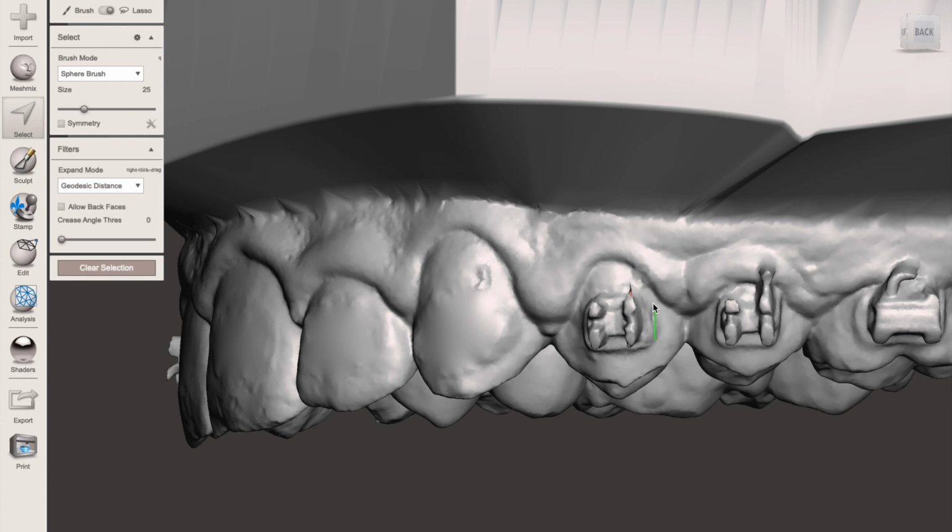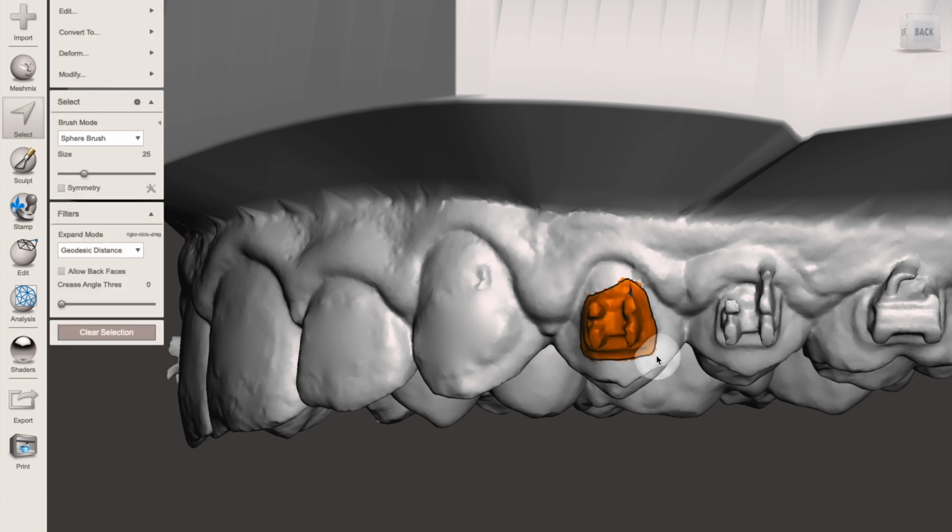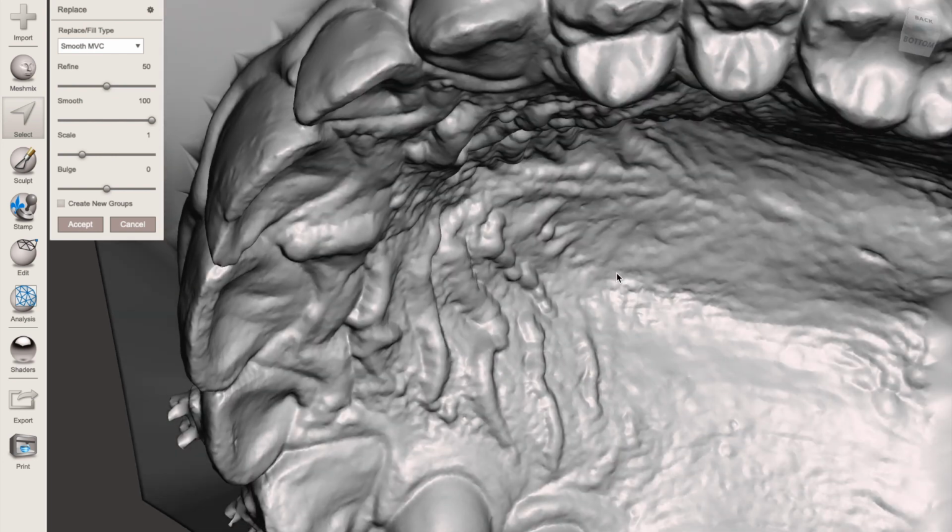So in this instance, you see there's a small crack just above the bracket due to a scanning error or something like that. When you finish your lasso, it'll show up black and nothing is selected. It's because of this little area here, that little crack. So when you select that and say you've got a little aberration there, just include that full portion, that crack, within your selection, and it will highlight and you can remove it just as you would with any other bracket.